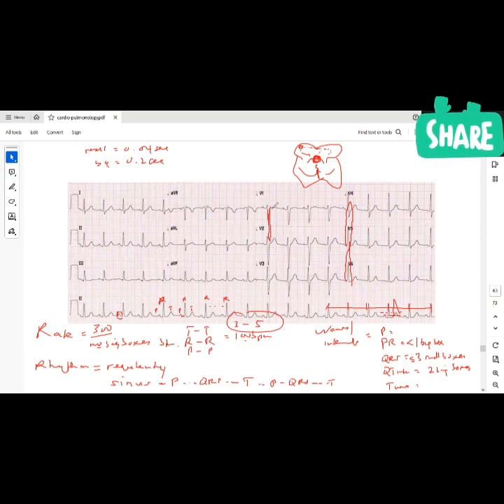If you count the number of small boxes between them, and each small box is a millimeter, and it's more than 35 millimeters, basically it's telling you there's left ventricular hypertrophy. So you add the depth of the S wave in V1 plus the height of the R wave in V5 or V6, and if it's at least 35 millimeters, is it 45? I think more than 35 millimeters, then you're dealing with likely some sort of hypertrophy of the ventricle. Those are going to be some other quick things to check on ECG.